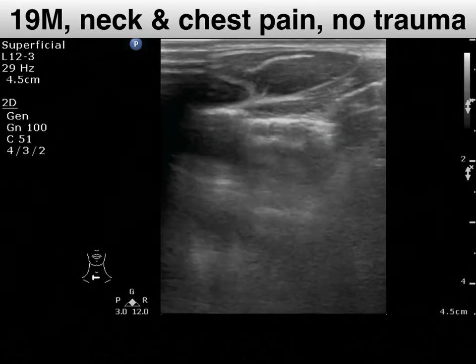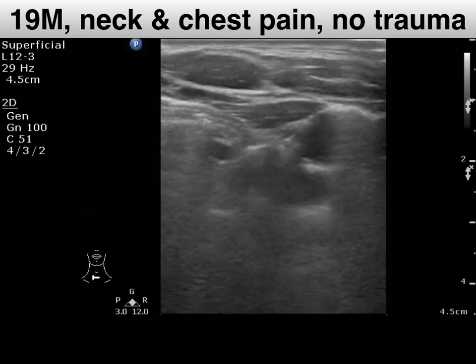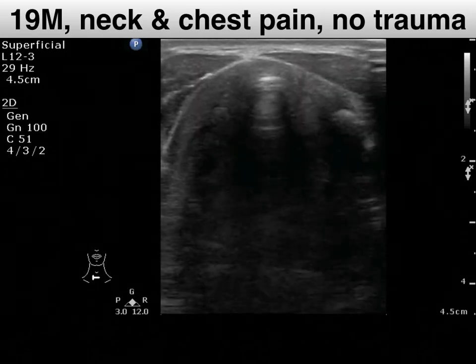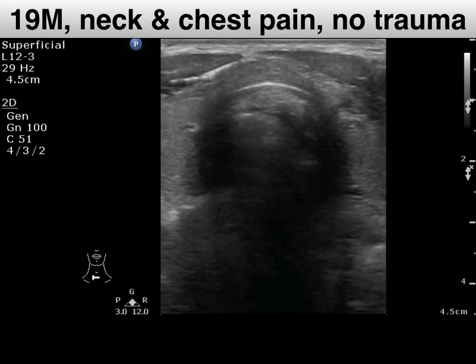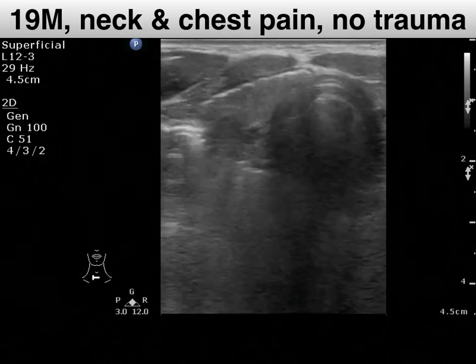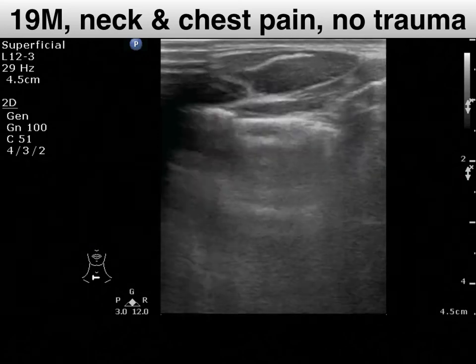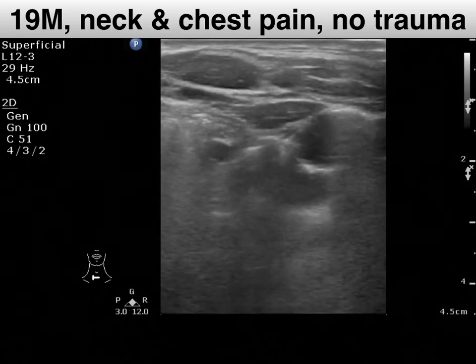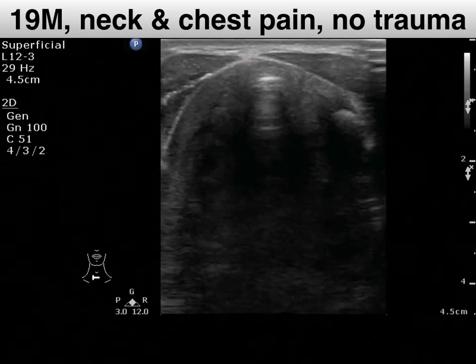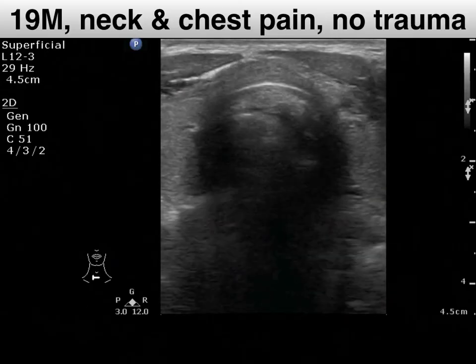Sometimes we just need to describe it then to find what is the problem. If that is hyperechoic and with shadow, we know that some kind of hard material, like foreign body, like bone, like stone. But that's hyperechoic with shadow, similar like the finding you observed in the lung section, right?